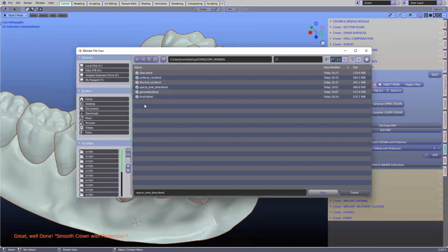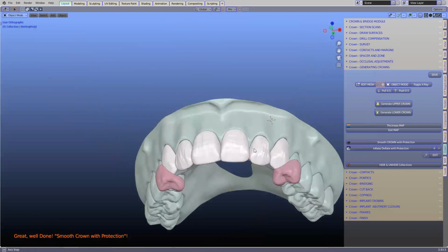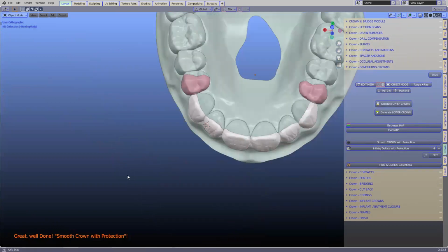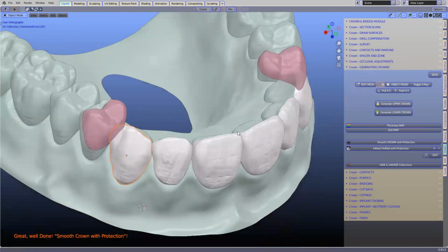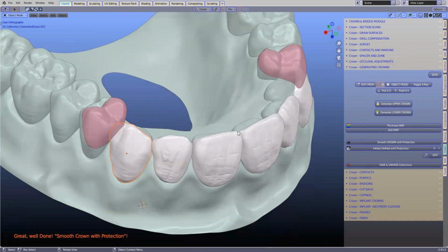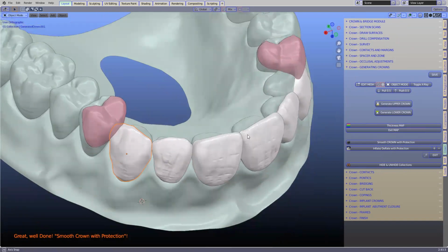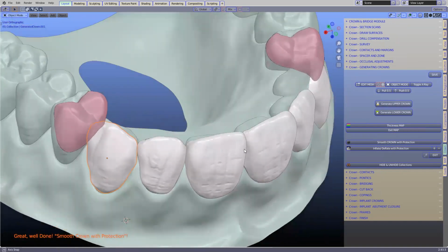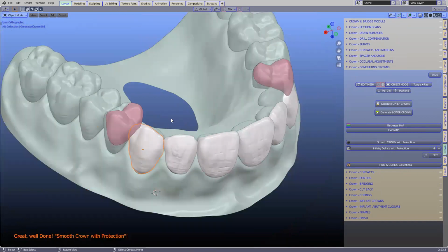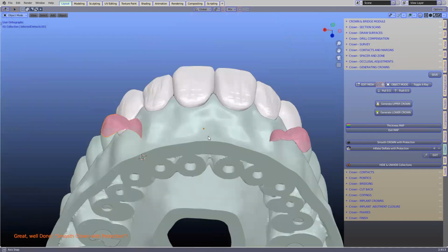Correct. We're going to go to where I've generated each and every one of these veneers, and I do recommend doing them one after the other. I've posted a video the other day where I took a full mouth rehab and did every alternative tooth, which also works, but be cautious of it because the teeth can't be close together. Okay, so yeah.